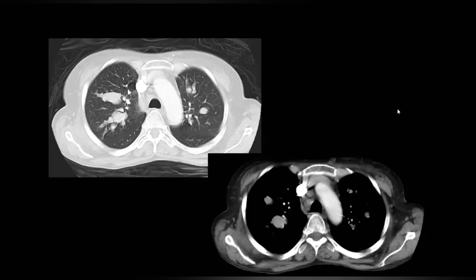So the disease involves both the right upper lobe and, to a lesser extent, the left upper lobe, okay? Yes. Okay. So what is this? These are likely mucus-filled bronchi and mucoceles, and it confirms my diagnosis of allergic bronchopulmonary aspergillosis.